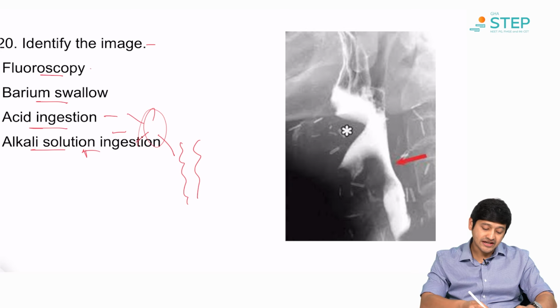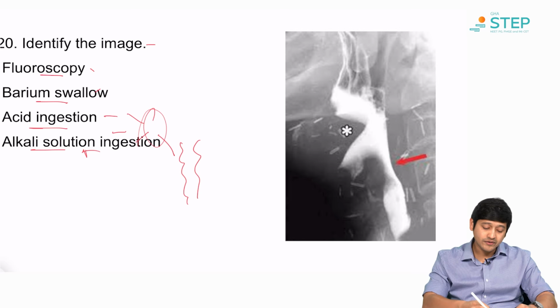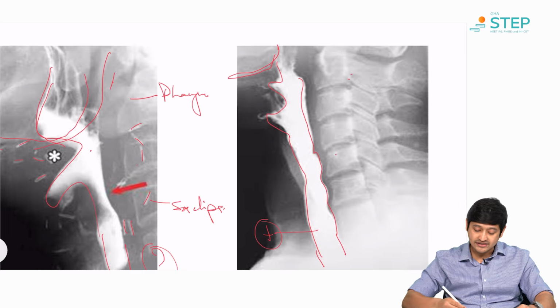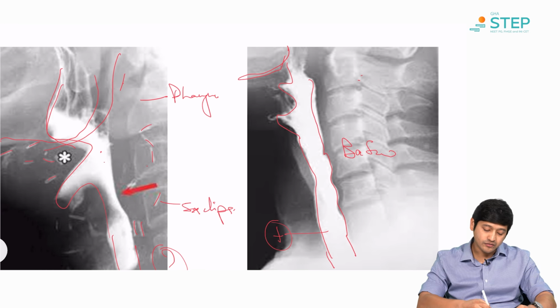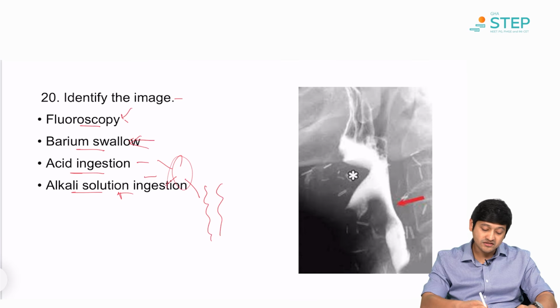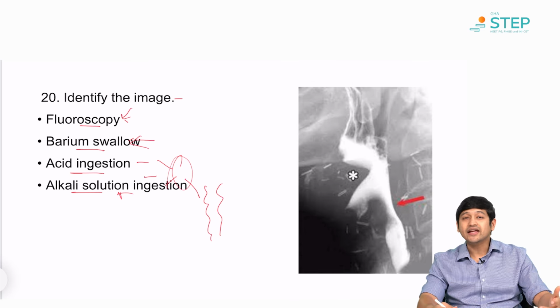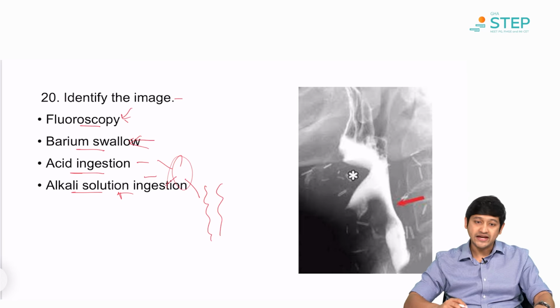So, what you have to decide is, are you looking at a barium swallow or are you looking at a fluoroscopy? Fluoroscopy is essentially the technique. This is the study that you perform. A barium swallow is this one on the right. This is a barium swallow, and you are left with your answer of fluoroscopy. Okay. So, you will have to tailor your answer to the question that's been given to you. If it's what technique, this becomes a barium swallow. If it's modality, this becomes fluoroscopy. It's basically like X-ray TV. You observe the contrast column going through the intestine.